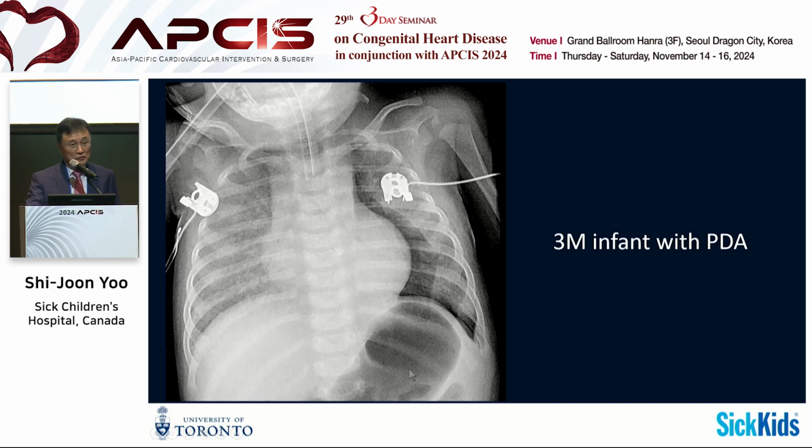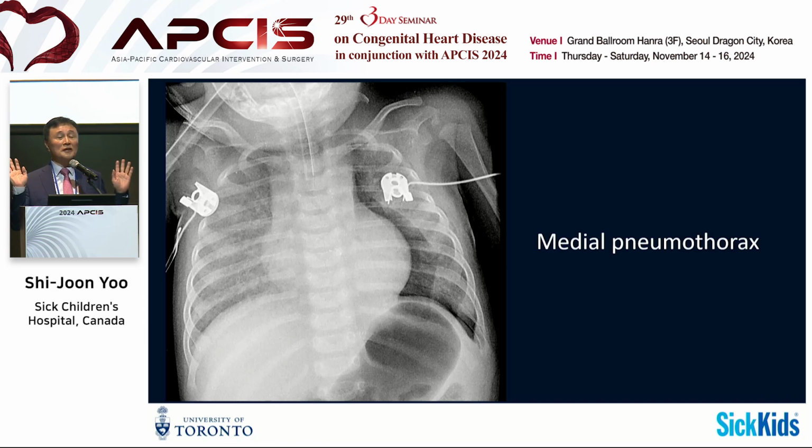3 months infant with a PDA. Just newborn. Can you see that there's some halo of lucency here? So this is a typical medial pneumothorax, because most of the chest X-rays are taken in the supine position. Small to moderate amount of pneumothorax accumulates along the cardiac silhouette. Okay, so that is a typical medial pneumothorax.